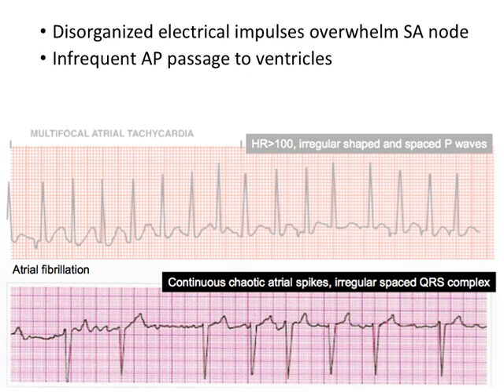Infrequent passage is indicative of the AV node still working. So even though we have atrial fibrillation, not all of those chaotic signals get through. We still have some beating of the ventricles, which would work to still pump blood. So we don't have disorganized disengagement of the heart and the ability to pump blood, which is, I think, what, Kristen, did you mention that last class? The idea that the AV node tends to slow down the impulse as it goes through the heart. So we still have that here. You did mention that, right? Yeah. We still see that here.